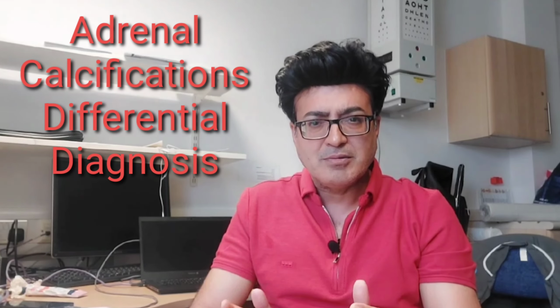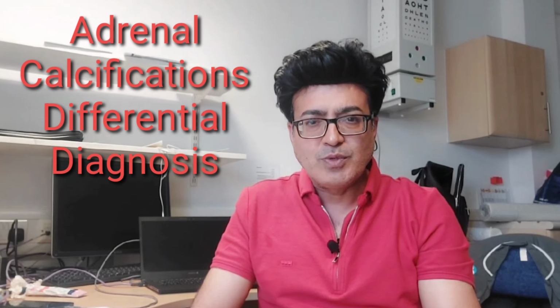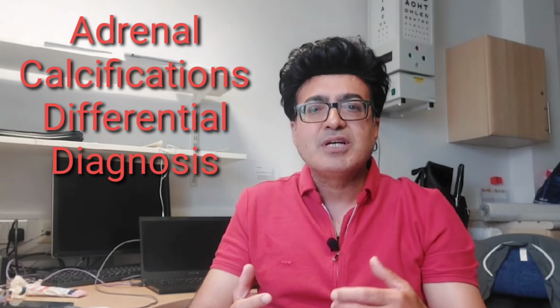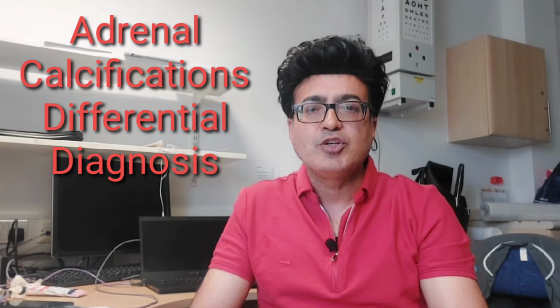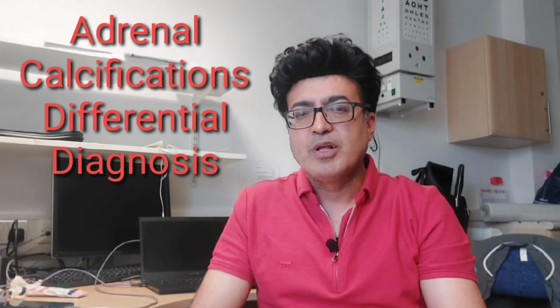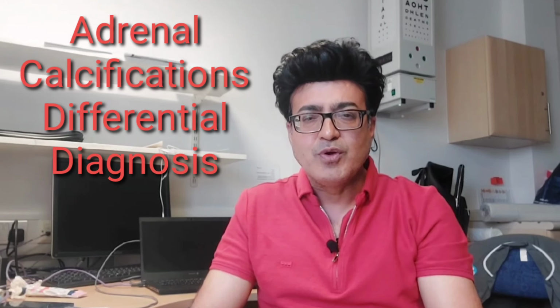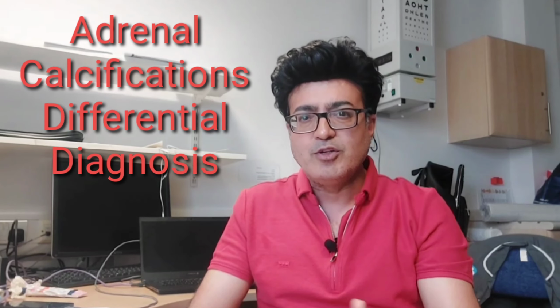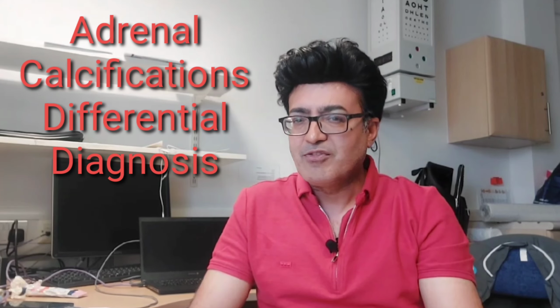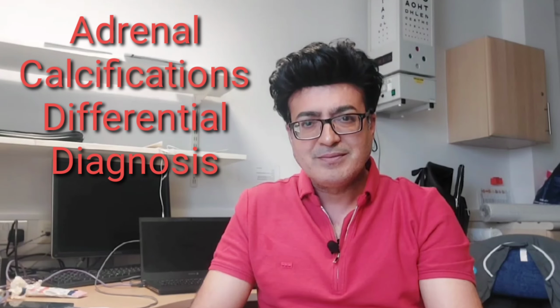So there are multiple differentials which I have listed in this video, along with the characteristics of the calcification you may be able to see on either plain x-rays or CT images. One should have this list in front of you while you are reporting adrenal calcifications. So let's start watching this video.